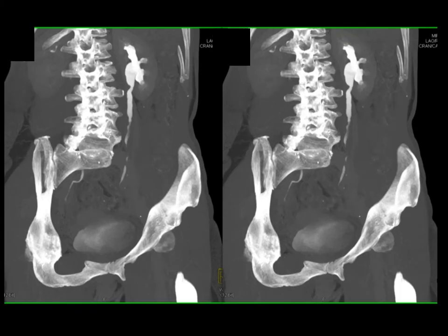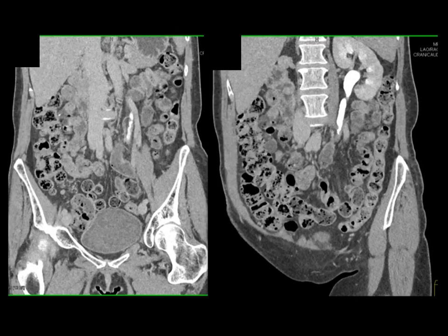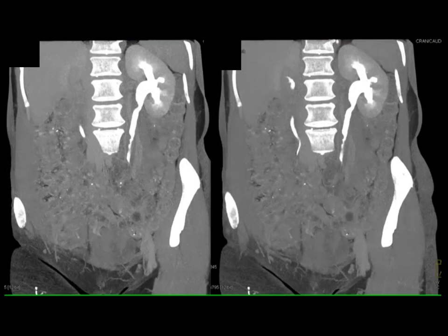And then when you watched it in axial and looked at the coronal a bit more carefully, you realize there's a soft tissue infiltration. If you would have had the 3D, look at the changes in caliber. That was a transitional cell carcinoma. So this patient was lucky. Patient had surgery early. But you can see how subtle these things can be.